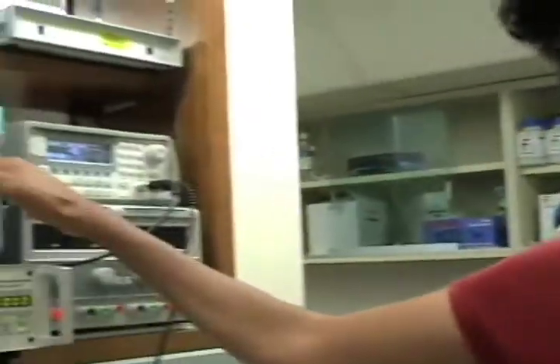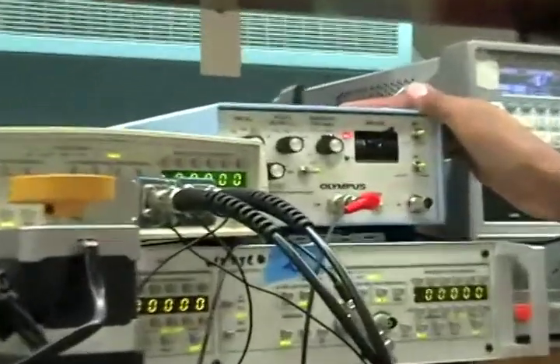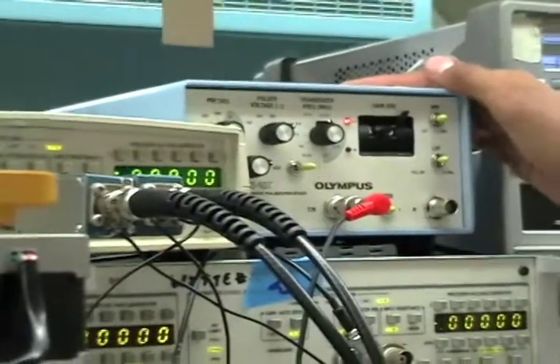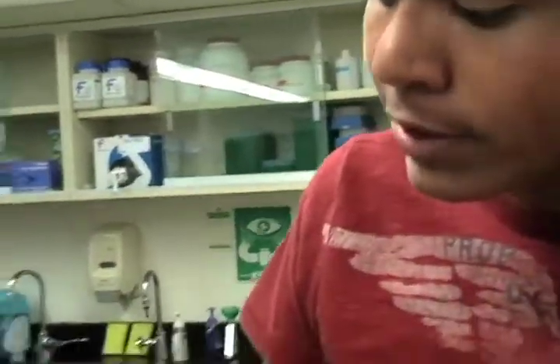The transducer is made out of an array of crystals that receive electrical impulses from this machine right here. And what happens is that when these crystals are met by this voltage, they expand and contract rapidly, so they produce a vibration which sends out a pressure wave or a sound wave from the transducer up towards the hydrophone up here.